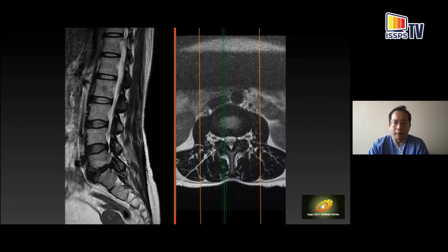Now, here's a very real world limitation of MRI. Sometimes the images are cut. The cuts that we get are too thick. It doesn't allow us to see through the interlaminar space as clearly as you would with an ultrasound beam. Remember, the ultrasound beam is at most about 1 to 2 millimeters in thickness, whereas with the MRI scans that we get, this is already 3 millimeters, which already, with one pass, would easily cover the interlaminar space. So you don't always get a perfect image.